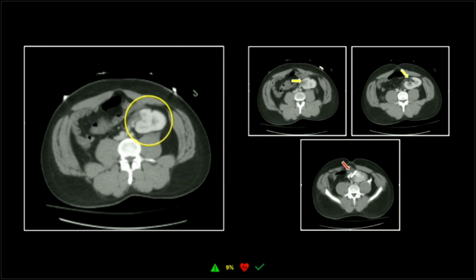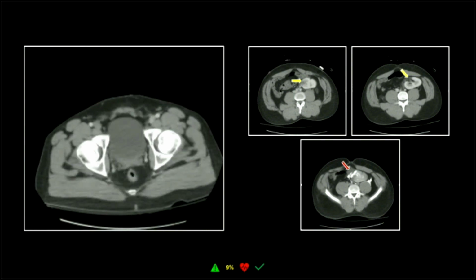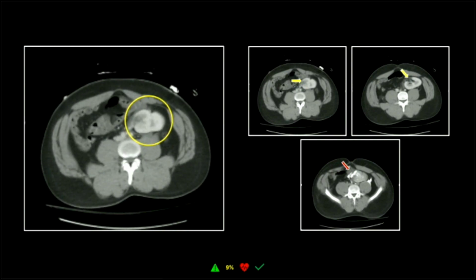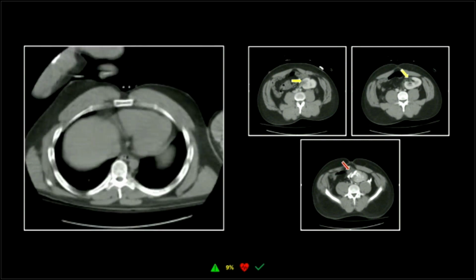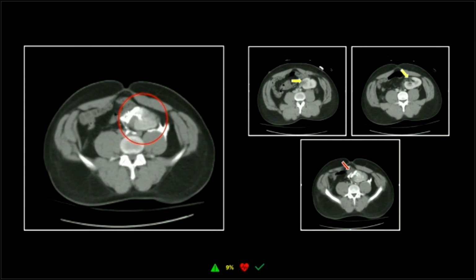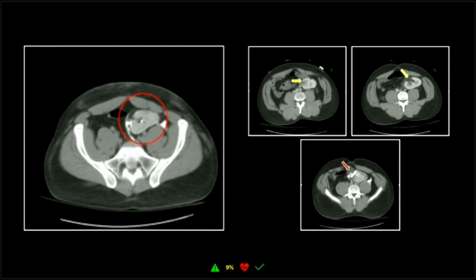So there's the original, and just those wisps of density on the right medial side of that pelvic kidney are all that you get. But it's enough if you see any evidence of a renal injury to suggest, I think we need delayed images here. And there it is. It's really quite extensive. All right, so that's another collecting system injury.